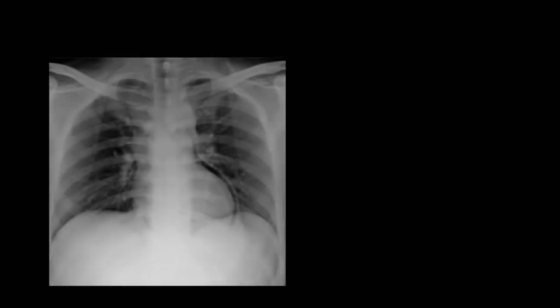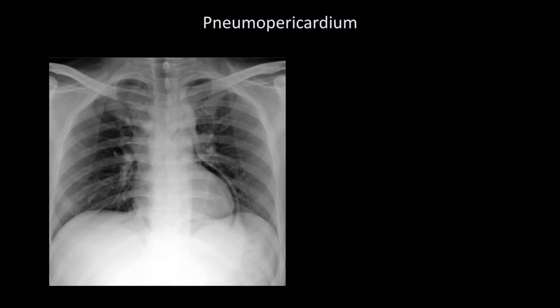This is easy to mistake for pneumomediastinum, but in this case the air is actually inside the pericardial sac, a condition predictably called pneumopericardium. This is distinguishable from pneumomediastinum because the band of air is always single and more well demarcated than in the other condition. While pneumopericardium can outline the base of the aorta and pulmonary artery on occasion, it cannot extend further superior to the aortic arch or neck.